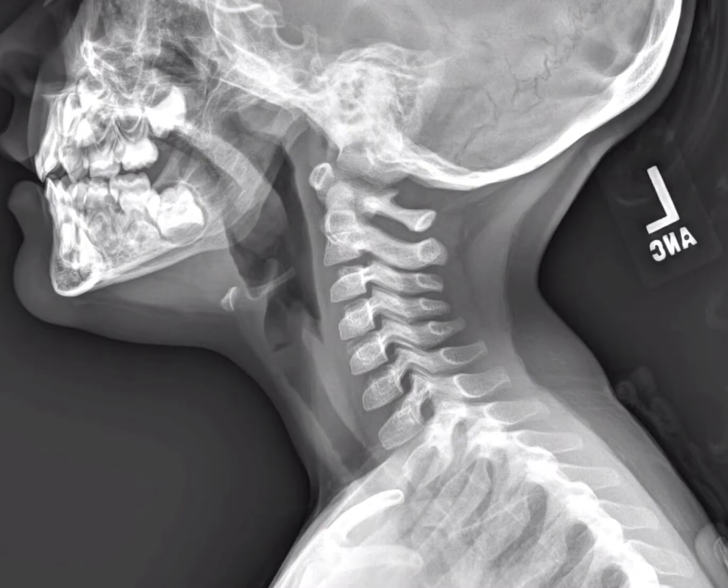Hangman's fractures, as well as other fracture types in the cervical spine, are also associated with thickening of the prevertebral soft tissues. There are specified limits for how thick this soft tissue is allowed to be. At radiography, generally at C2 to C4, it should not be more than 5 to 7 millimeters in thickness. Some people use the AP dimension of the cervical vertebral bodies as a reference marker. At the C2 to C4 level, it should not be thicker than half of the AP dimension of the cervical vertebral bodies.